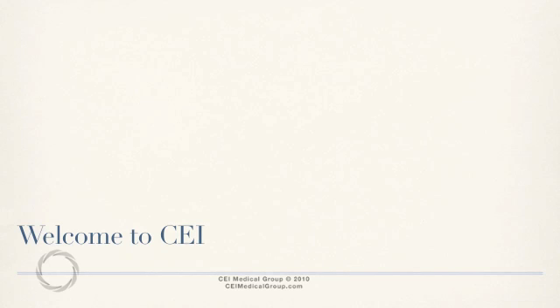We've put this tutorial together to help you understand a primary part of your upcoming hearing test, the audiogram. By the end of this tutorial, it's our goal that you will have a fuller understanding of how to read your audiogram and interpret what this could mean for you. Let's begin.